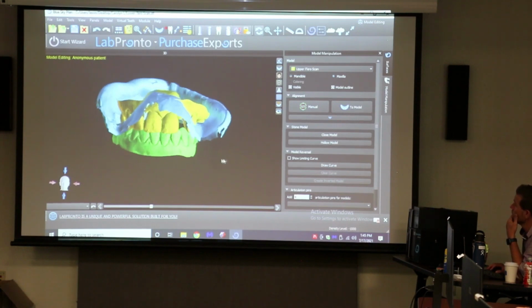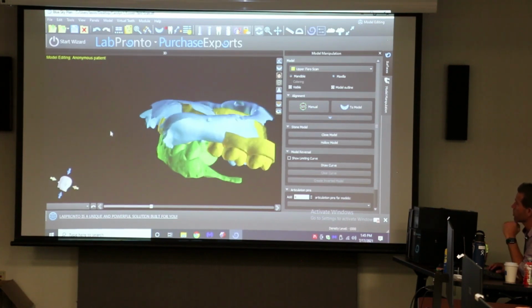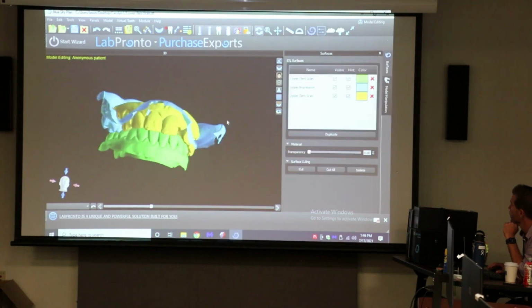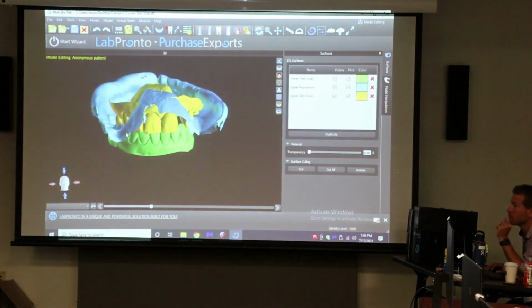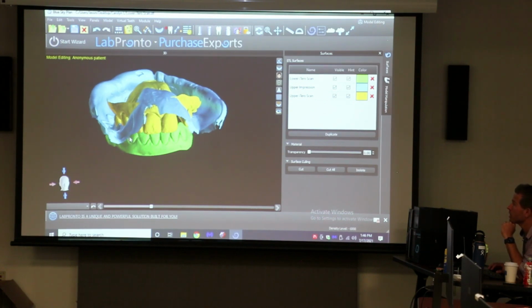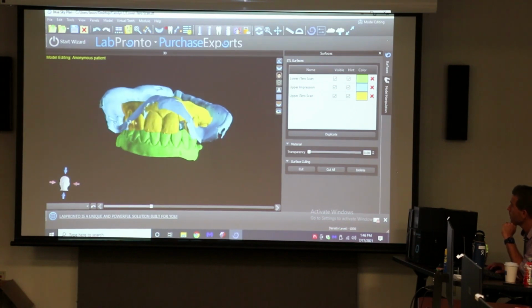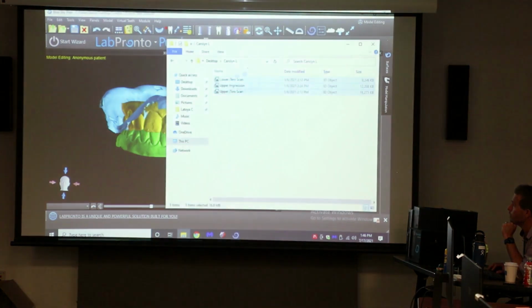Okay, so everyone should get a screen that looks something like this. Now, the reason why... We have to do each one from that? No. Sorry, yeah, just that yellow model, you aligned it. How did it import all 3 of those if you just imported the yellow one? So I drag and dropped all 3 of these models in at the same time.